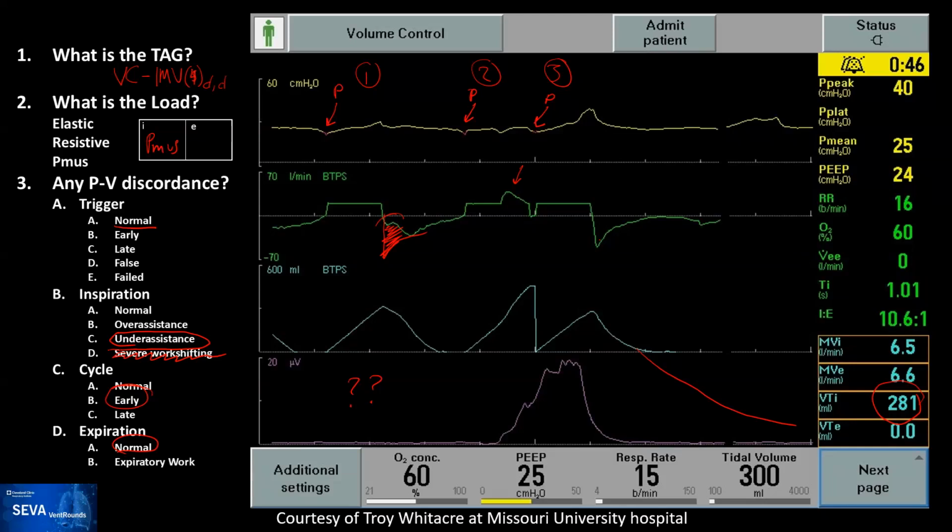So evidently the catheter, and this is one of those images that I would like Cinderby to talk a little bit more on what is happening here, or what he has seen, is using the crura from the diaphragm. So is there partial injury, or is there desynchrony because one crura is not present or paralyzed and not transmitting, and the other one is? And so there's pendeluft and discordance in the activation of the chest wall muscles. It's very, very, very intriguing.